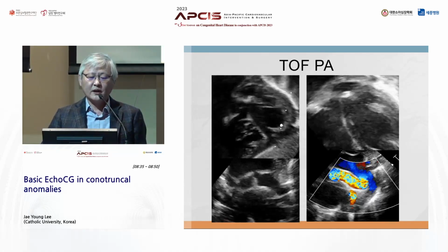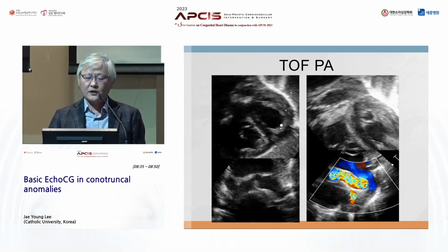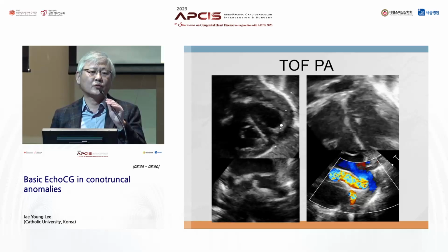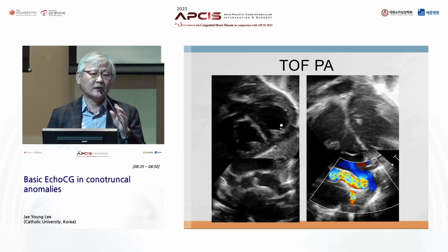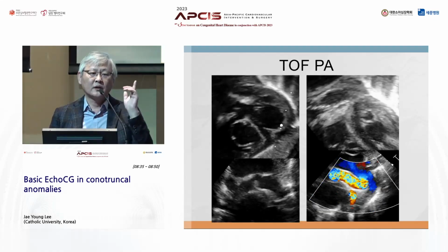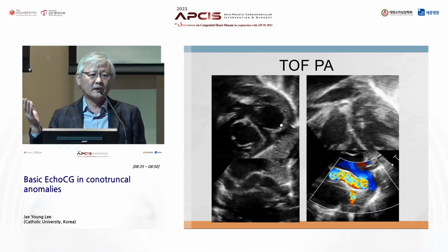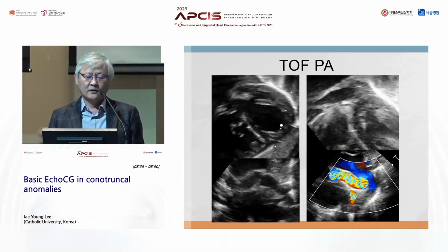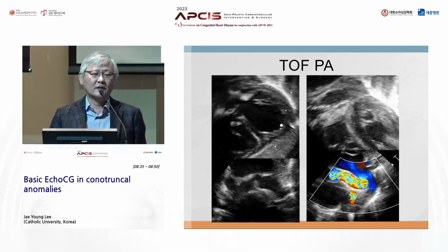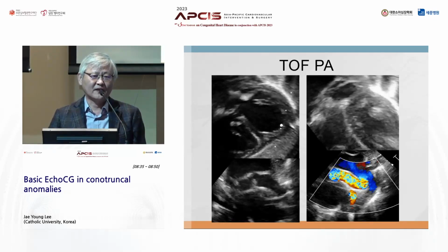In pulmonary atresia, the basic intracardiac anatomy is similar to tetralogy, and importantly, in this case, to identify the pulmonary artery system anatomy and the source of the ductus arteriosus for initial palliation, shunt or PDA stenting, or early repair. But also, this anatomy can be identified well by CT angiography.